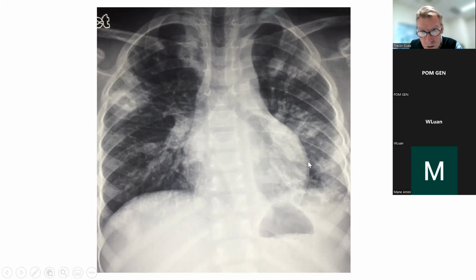When you see the bronchi dilating up like this, you can't always see it, but sometimes you get, and it's not diagnostic, it's just suggestive. So I would say that looking at the bronchi coming down here, it's suggestive of what? You can see some almost like cystic-like areas distal to the bronchi. What might you think that is? Emphysema. Yeah, it could. That's right.